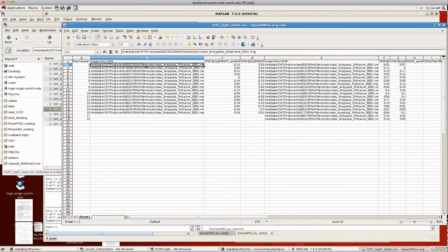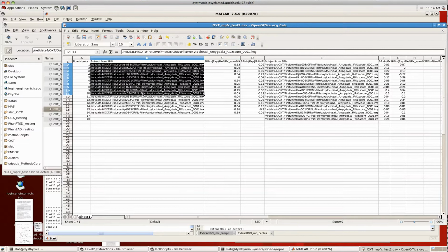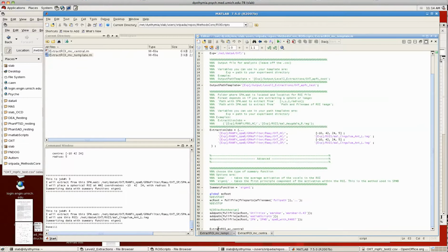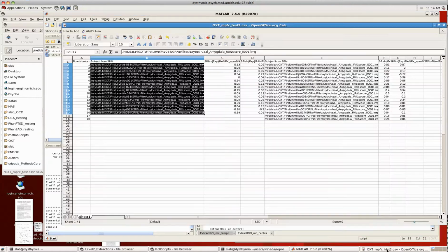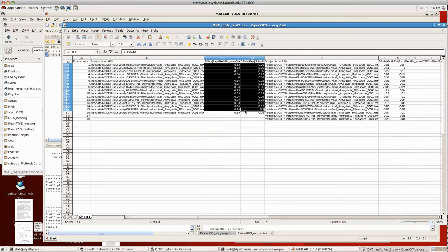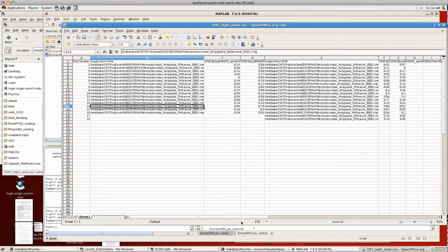The header column over here lists the subjects and images that were found in that spm.mat. If you'll recall, the first two spm.mats that I used were exactly the same. These two right here. So notice that the output file has intelligently, not redundantly, printed the contents of both spm.mats. It lists just one, as well as the betas for each subject, for the subjects and images that it found in this spm.mat.